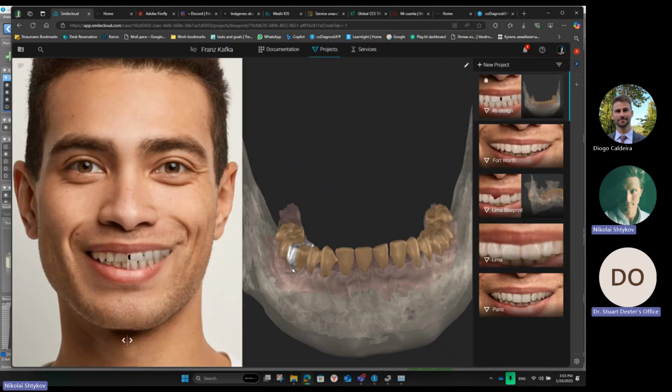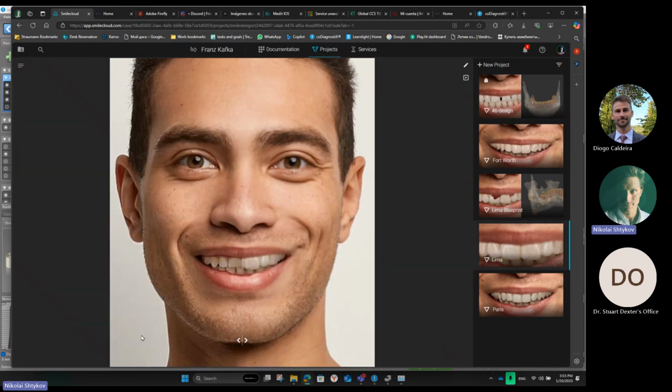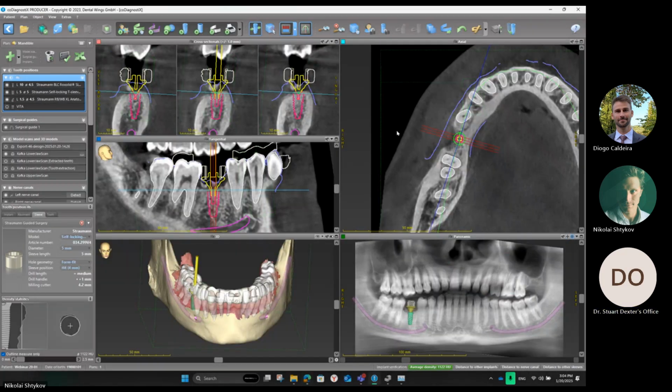In the legacy SmileCloud design, you can export only upper teeth, and they will not be in the same position. In the 3DNA, we can design it, but for example, here we have SmileCloud design of the teeth and export everything. But this is not about this topic. We would need to go a little bit deeper and spend more time on this. But this is not too difficult. This is another project. You can go to SmileCloud. I just use it to show that it's easy to export from whatever you want. Got it. I thought it was embedded into the system originally, but you're just going to a web page. Yes, this is the cloud version. This is very nice, very helpful software.